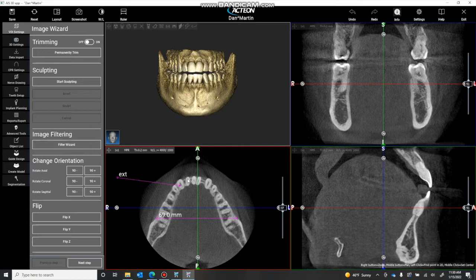One thing to note is this data that we put here is only applicable to this slice of the view. So what I mean by that is if I move to another slice, see this red line here, it's this red box.